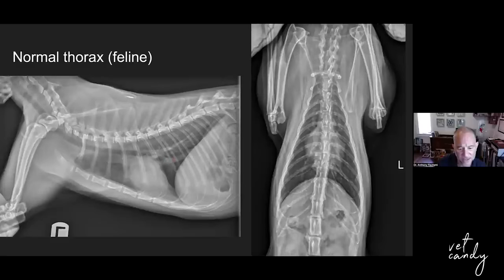This is the caudal vena cava, and there's your artery, bronchus, and vein, but it's a little harder to see the vein. Artery is on this side, again, away or out laterally, and those are your pulmonary arteries. It's the cardiac silhouette, liver, stomach, transverse colon here. Okay, yeah, and we use restraining devices to keep them still for a couple of seconds.